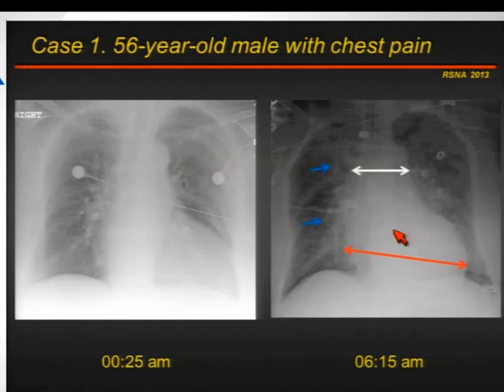We'll start with a patient who came through our chest reading room last week, and his first radiograph was obtained because he had very nonspecific chest pain. He rapidly progressed to pulmonary edema, as you can see on the second radiograph on your right, where we can see dilated pedicle, increased heart size, redistribution of the blood flow, and interstitial changes.